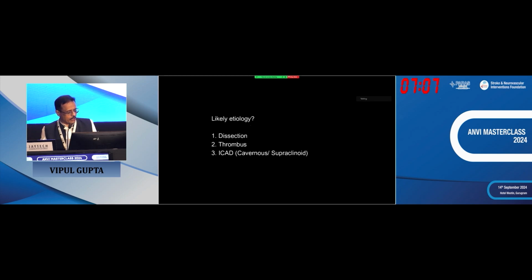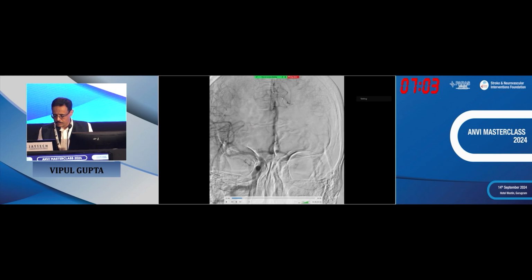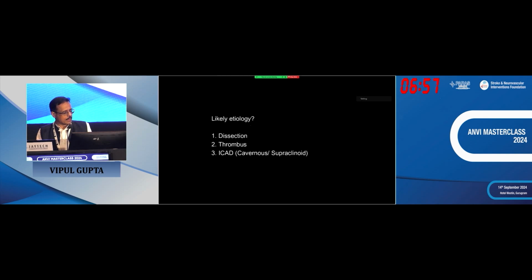All right, etiology here. All right, we go back. Again, etiology, what would one suspect? Is it a dissection, or is it a large clot sitting in the ICA, or is it ICAD? Matthew, what would you be thinking of at this point of time? No, I mean, the history is very suggestive of dissection.